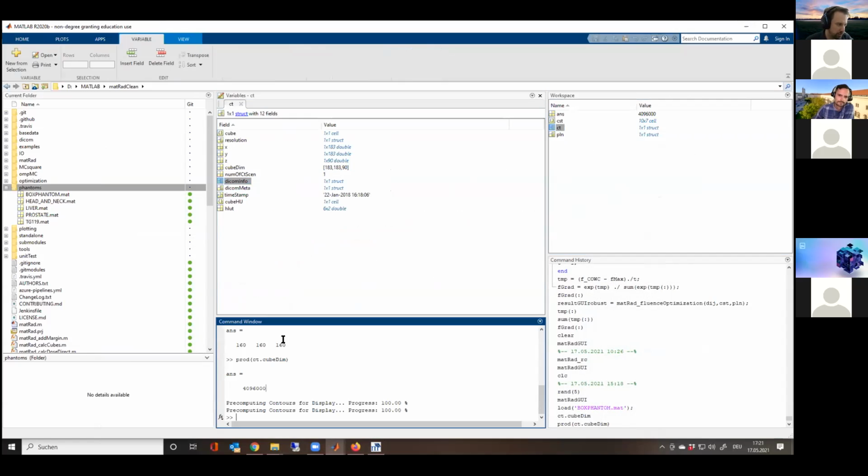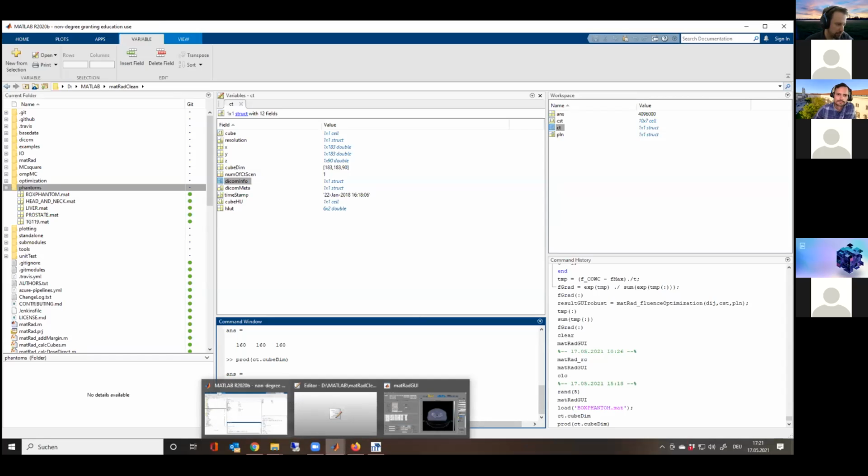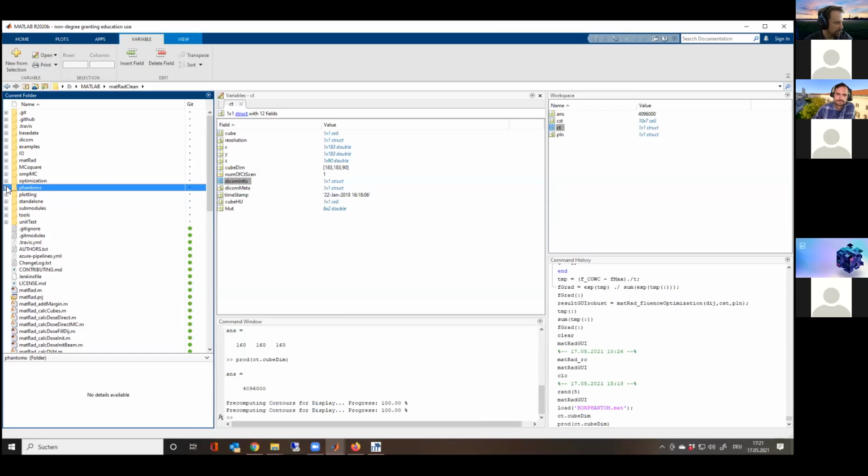Of course, it will not be just looking at variables. We will also change some stuff in there. And yeah, this is the duality you were earlier talking about. Yes, script versus user interface, and you can use both at the same time. So that's what you should be able to do when you use the code for now.